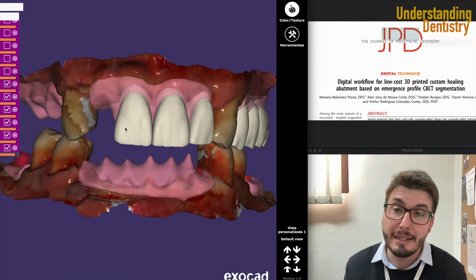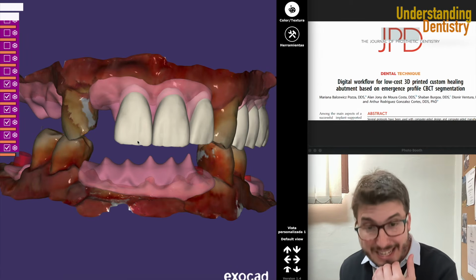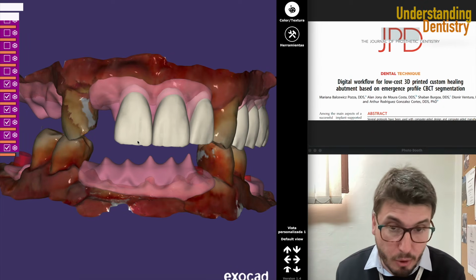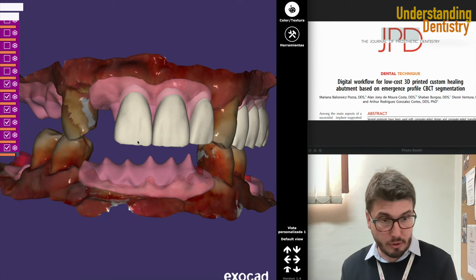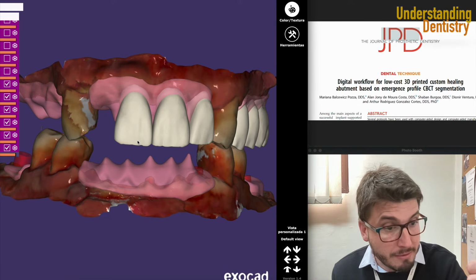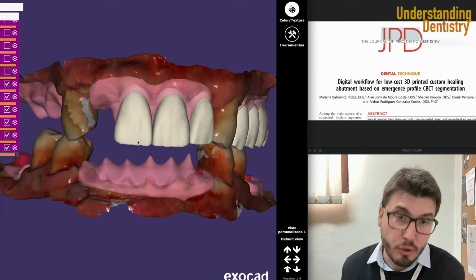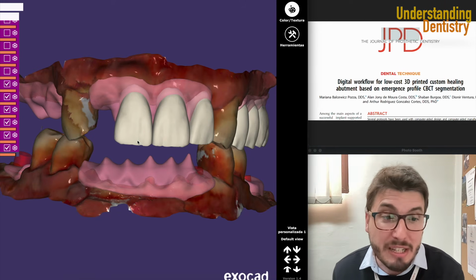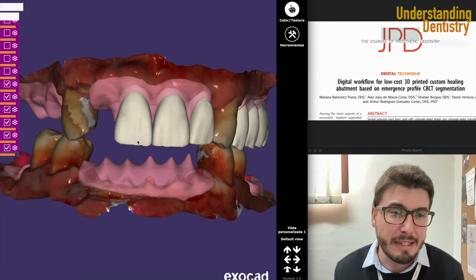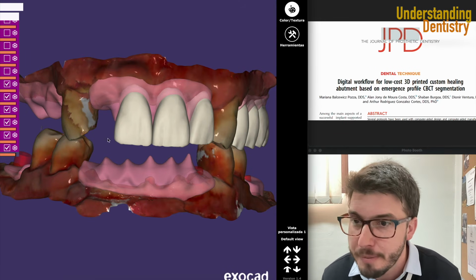Also, don't forget that the CAD/CAM technician will design your central incisors based on incisive guidance in protrusion, and based on the canine guidance in lateral excursion. So the principles of occlusion, right? Axial loading, okay? Lack of contact in the non-working side. So those are the principles of occlusion. If you don't remember, go back to our video of principles of occlusion, very nicely summarized and teaching you how to adjust the occlusion on these principles.